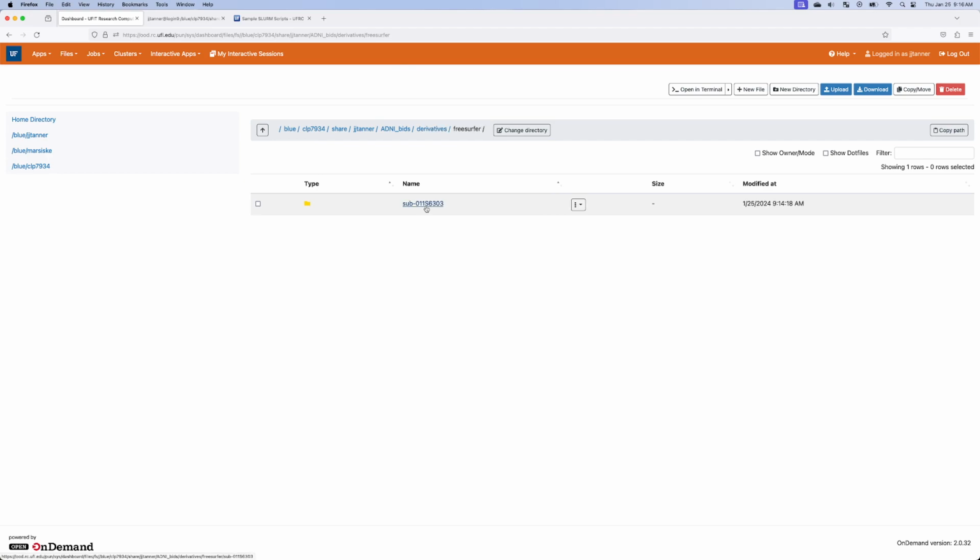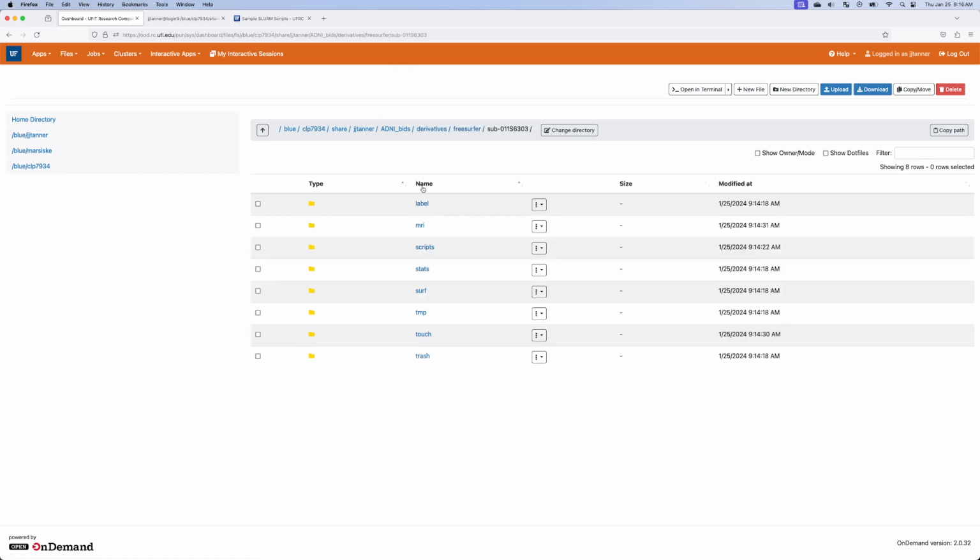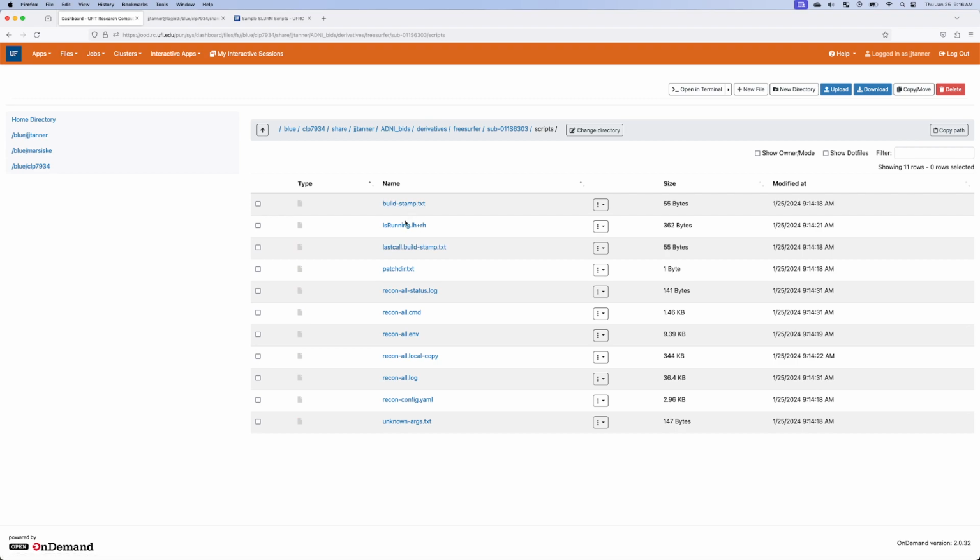Now there's this subject that has been created, with multiple files and directories. And then there's the scripts, and the log file, and all of this. We'll go over those in a future video and a future class. But this is working, so we'll assume this will complete. I did both of the brains in the same script, so the next one will start once this one is done, and then I'll get an email when it's done. And that's it.